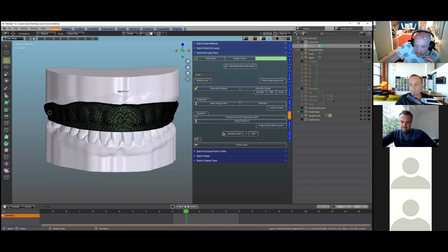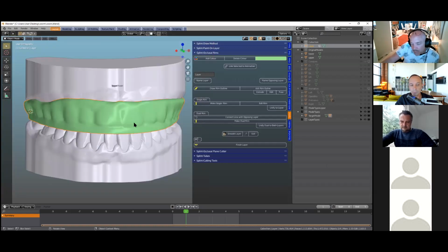We don't want to end up with a mesh that you put in a printer and then, after all this hard work, it fails and it doesn't print. So we're trying our best, with all of our modules, to get the mesh integrity, especially for crown and bridge work. We need everything, every vertex needs to be in its place. We don't want anything happening because that's disastrous.